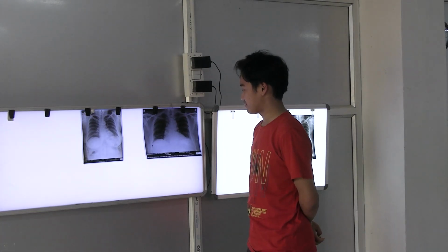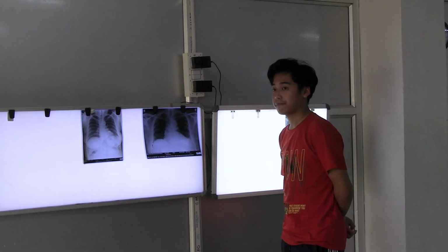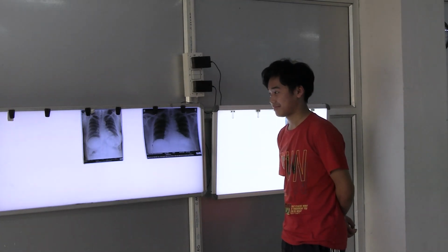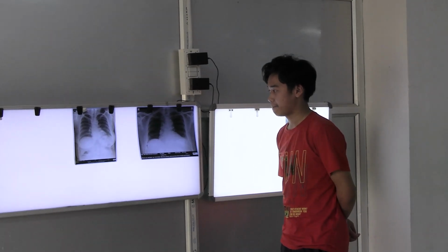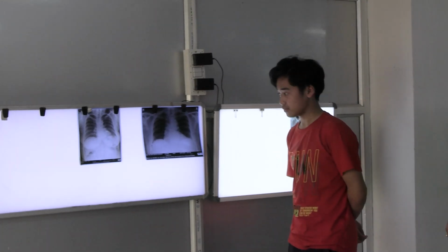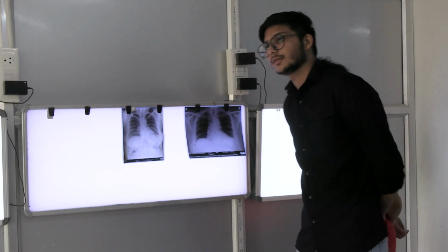Who can show the right border of heart? Right border of heart. Okay.